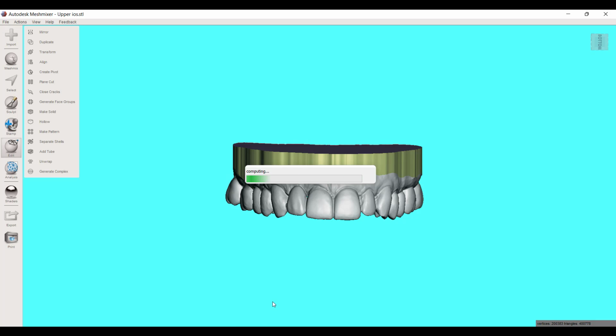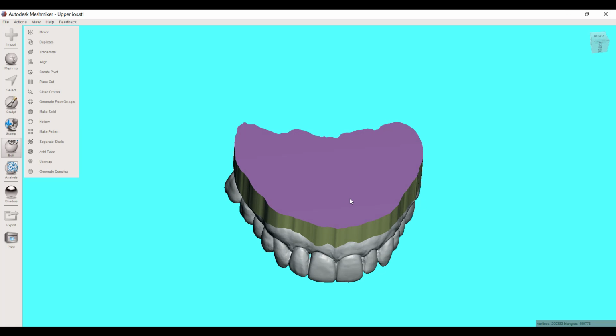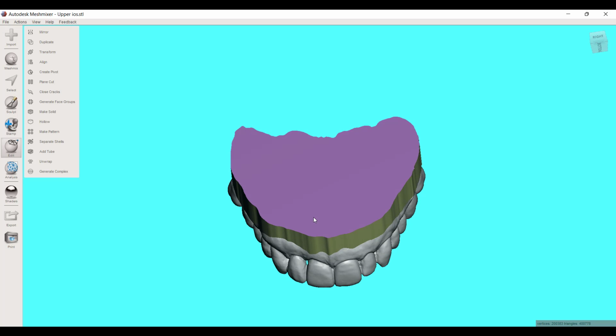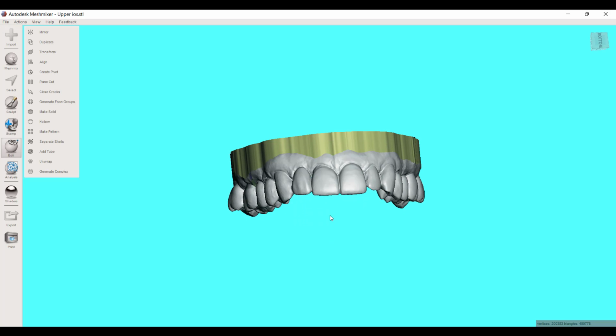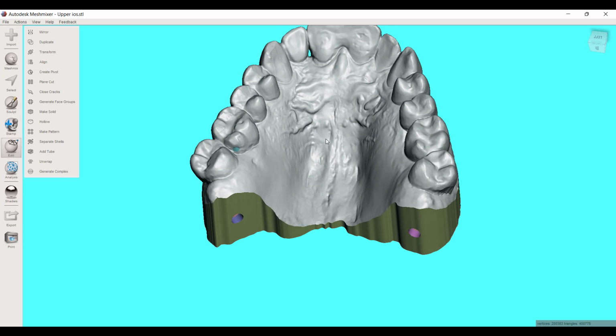And now you just simply drag that into your 3D printing software, orient this base to the build plate, and most of the printers are going to have some mechanism to tell you, is this printable? Are there overhangs or anything? I know the SprintRay that I primarily use will tell you if this will print without supports. And usually if you orient this flat base to the build plate, you probably won't have to use supports. But it'll tell you if it needs them. If you need supports, just tell it to add supports, and now you're ready to print that.